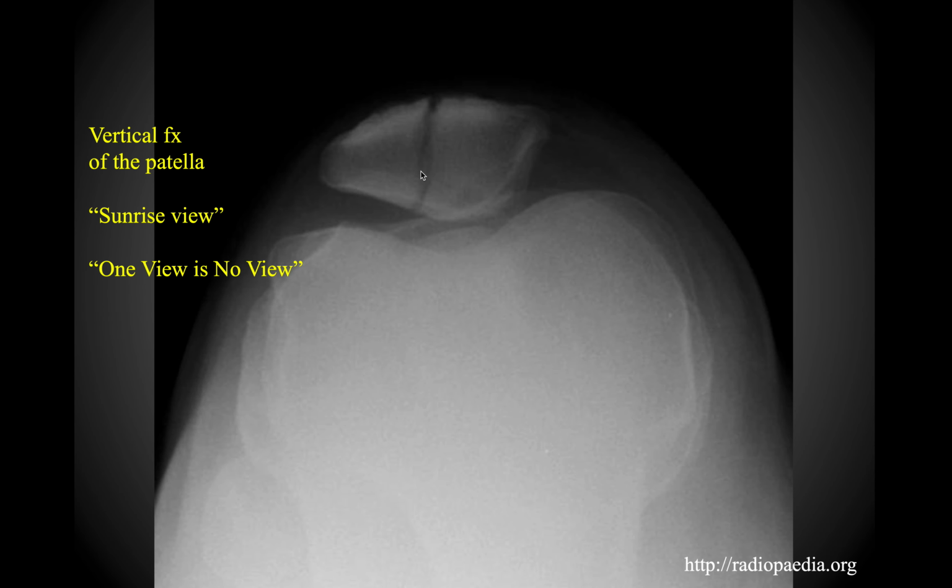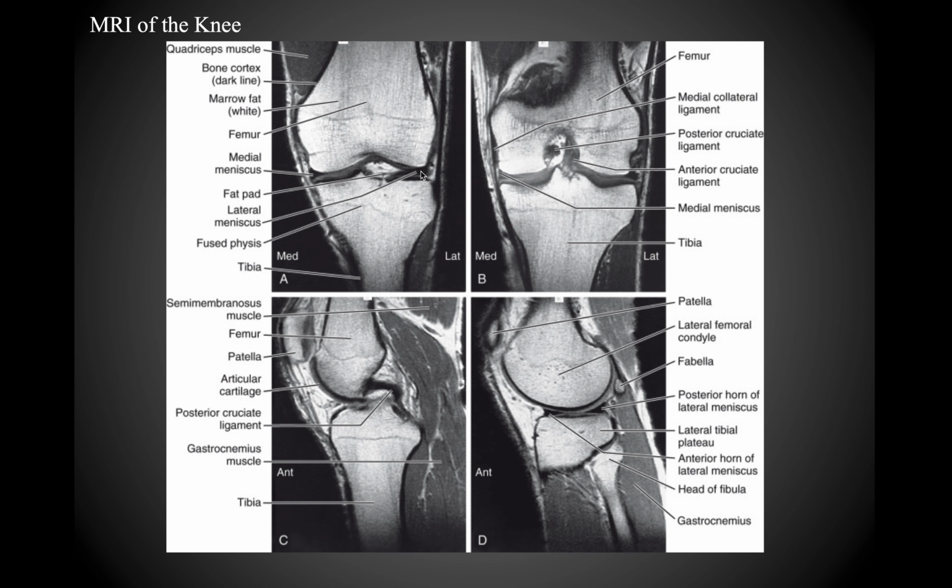And so in this image, what was done was the knee was flexed, and then the image was taken from above the knee in order to be able to easily appreciate the patella without having to look through another bone to do so. And so this is another great example of the saying that one view is no view in radiology. Now we're going to look at some MRI scans of the knee.